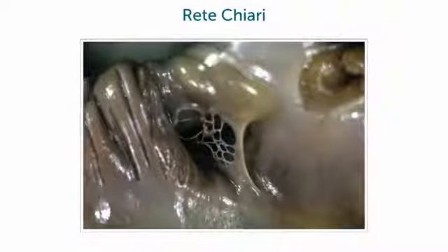Here is an example, a specimen of such a Chiari network. You see the network is located in this region. And if you perform echocardiography, you have all these orthogonal cuts of this network, which sometimes appears if there's contrast in the right atrium.